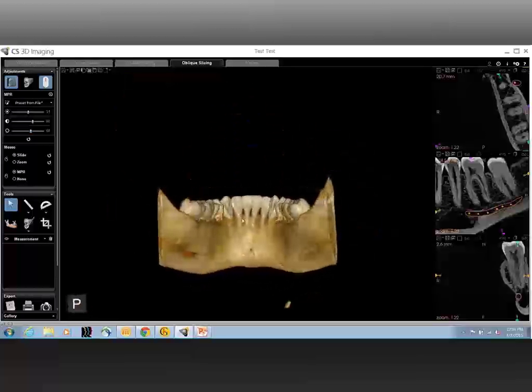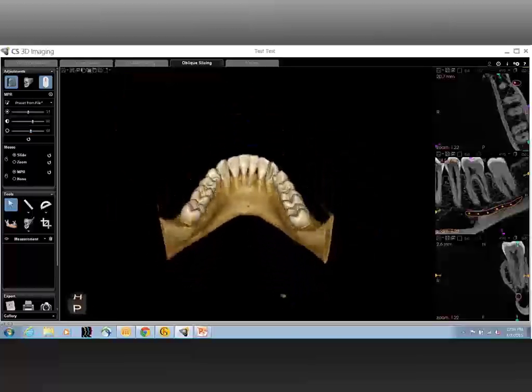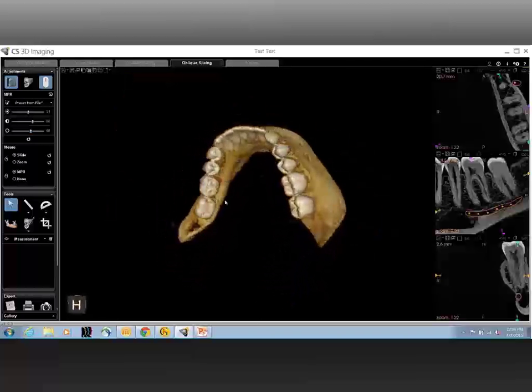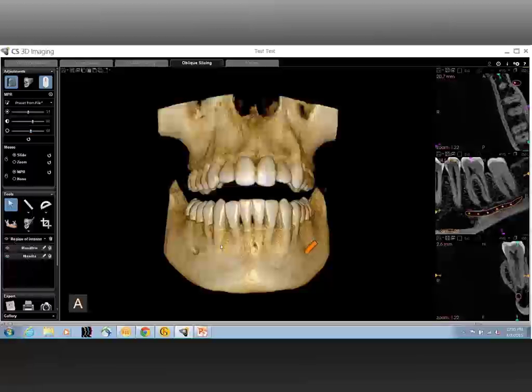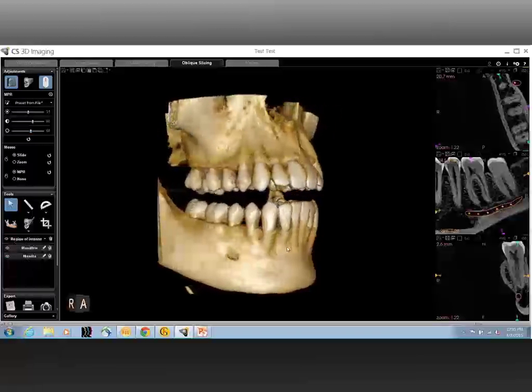Now, calcified lingual tonsils are very commonly visualized. Not a very serious finding unless there's some history to it, but can also be visualized in a different view. Calcifications in the thyroid can also be visualized. And on a more serious note, carotid atheromas: in a slightly larger field of view where you can capture up to the angle of the mandible and the ascending ramus of the mandible, you would possibly be able to see even carotid atheromas if they are present. It should also be noted that carotid atheromas may be visualized even on a two-dimensional panoramic and not just on a three-dimensional scan.